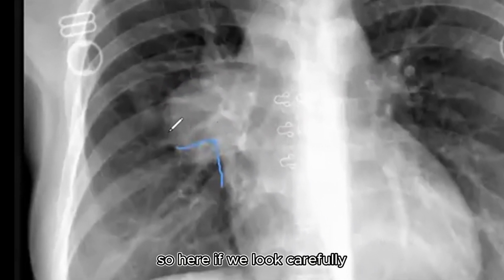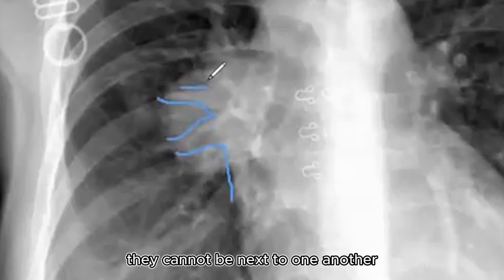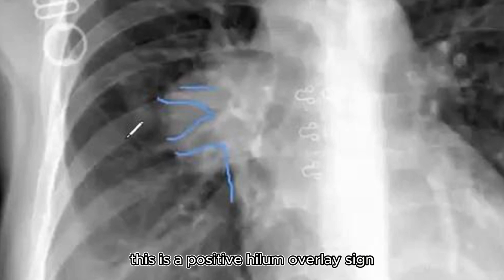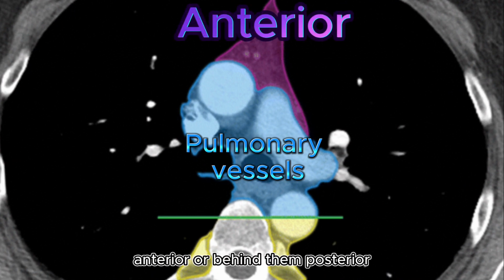So here, if we look carefully, we can still see the hilar vessels. This means that the tumor and the hilar vessels cannot be next to one another. Otherwise, we shouldn't be able to tell them apart. This is a positive hilum overlay sign. This means that the tumor therefore must be either in front of the pulmonary vessels, anterior, or behind them, posterior.